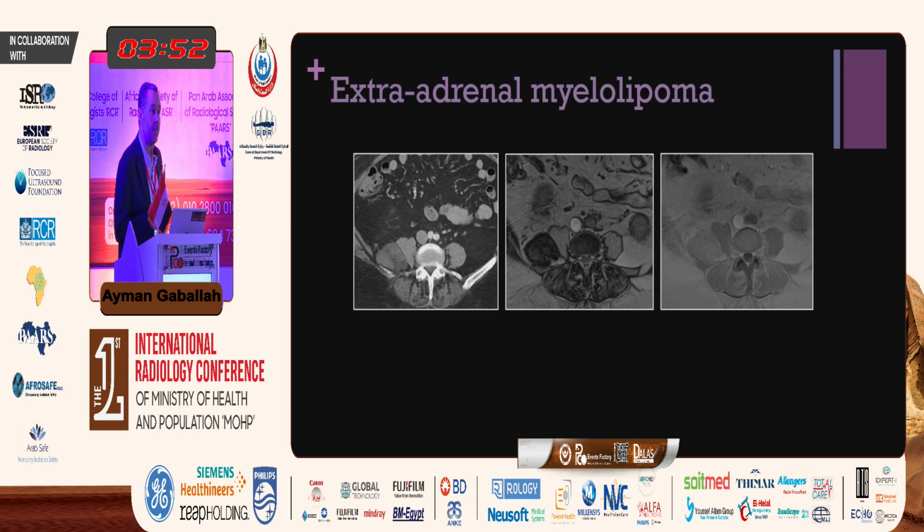We may think of liposarcoma. And to be honest with you, we had done the same with a few more cases before that case. And actually, 2 of those cases came back as extra-adrenal myelolipoma, and we learned our lesson the hard way. Then we started to think about something else.